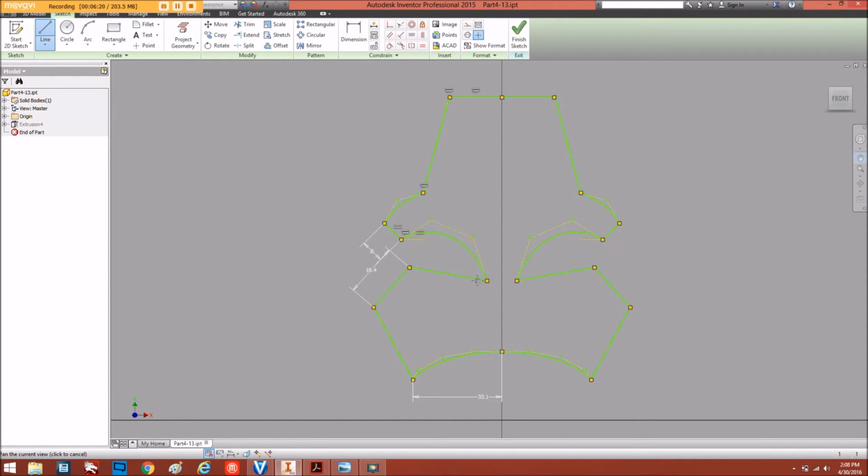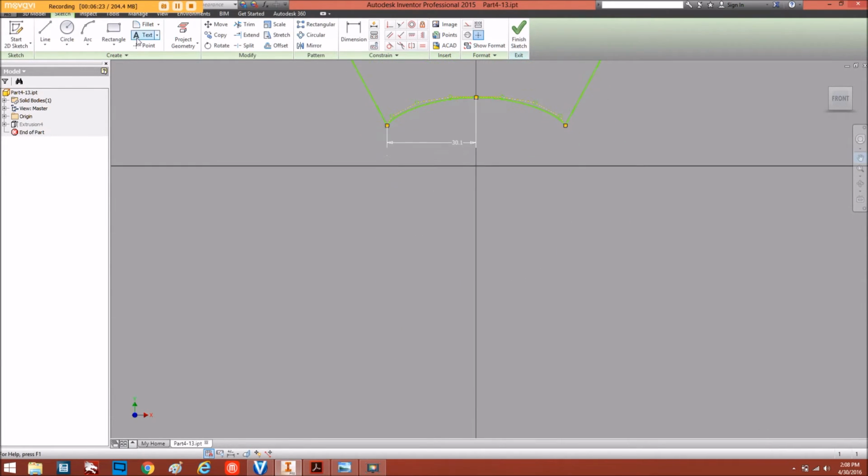let's go a little bit down here, we'll make a new one. I'm going to start right here. Okay, this is your starting point, which can be 0 right here, but we're not using 0. And then you're going to go down to whatever distance you have on your landmarks in the midline. So as I said, you want to do as much as possible, so they're going to be close. But in this one, let's just say we're doing a centimeter in between, which should be a little bit more. Let's just do a centimeter. All right, so 10 millimeters.